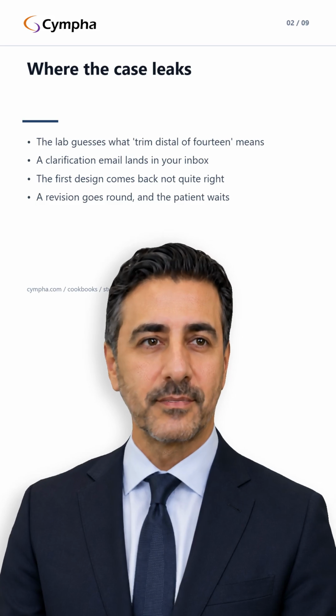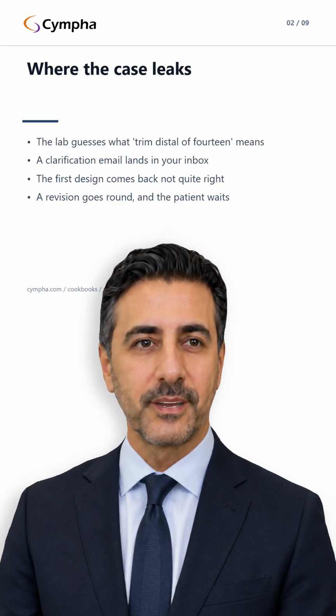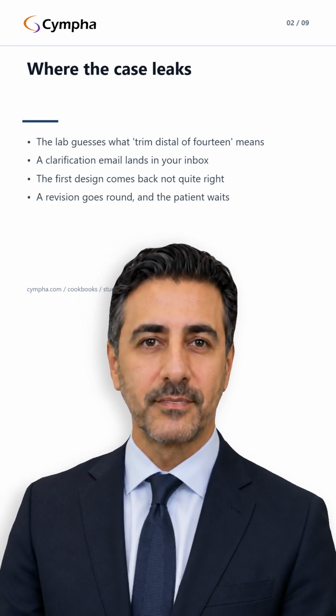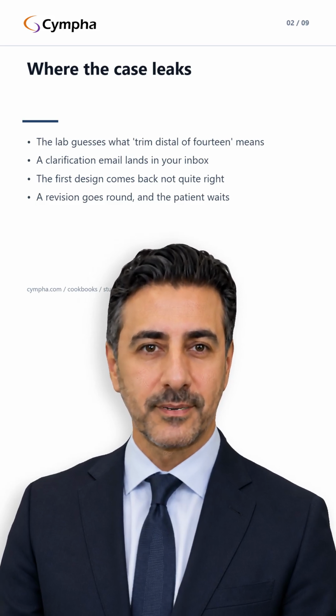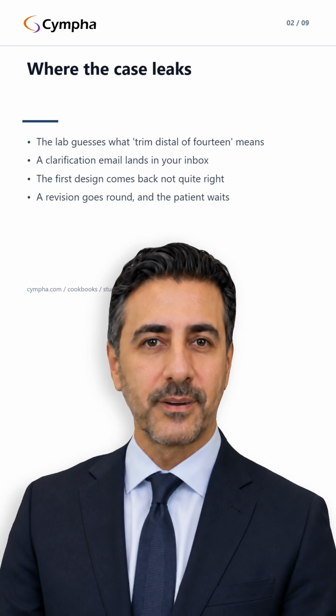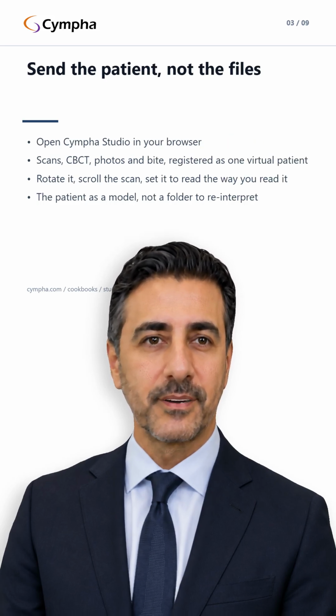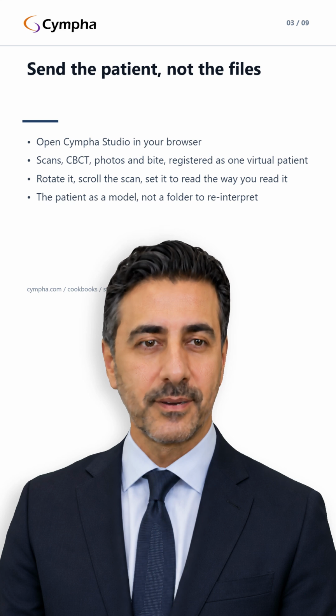Here is the loop every referring doctor knows. Typed instructions are a lossy way to describe something spatial. The lab does its best, guesses and asks. You answer. The design comes back solving a slightly different problem than the one in your head. And now you are a revision behind, with the patient waiting on all of it. Cympha changes what you send.